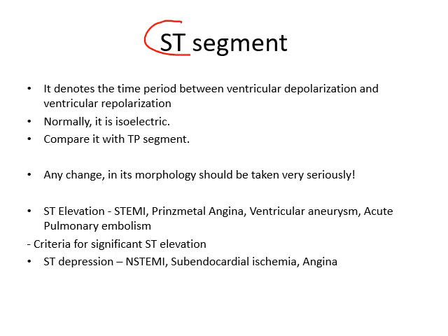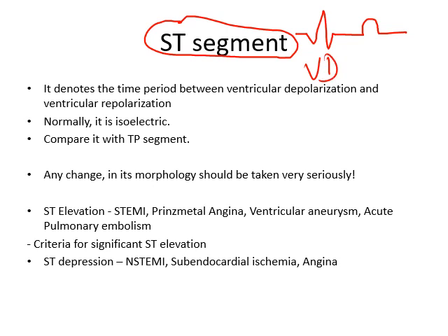Let's talk about one of the very important areas of ECG called ST segment. Now, ST segment is measured from the end of QRS complex to the beginning of T wave. As we all know, QRS complex denotes ventricular depolarization, and T wave, about which we are yet to talk, denotes ventricular repolarization. This is the area between these two, that is end of QRS complex to the beginning of T wave, and it should normally be isoelectric.